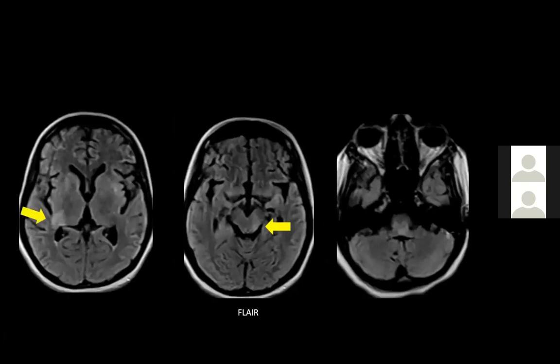So again, we signed out as a demyelinating disease with typical findings suggestive of neuromyelitis optica because of involvement of the area postrema that is classic for NMO, and the cerebral peduncle and corticospinal tract.